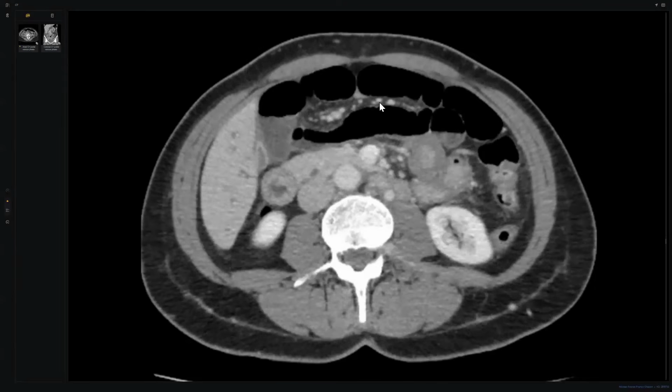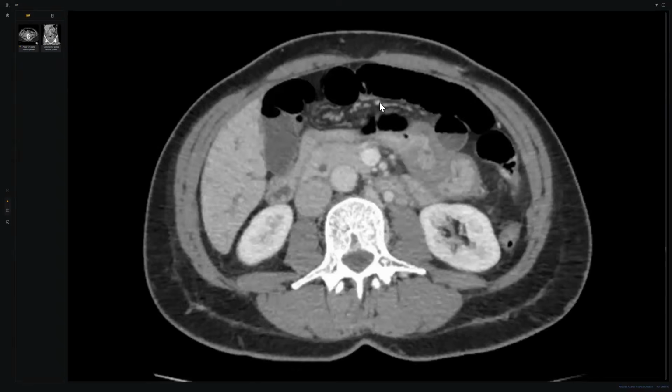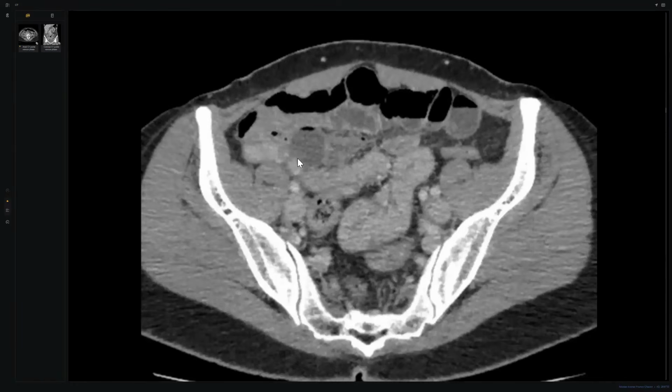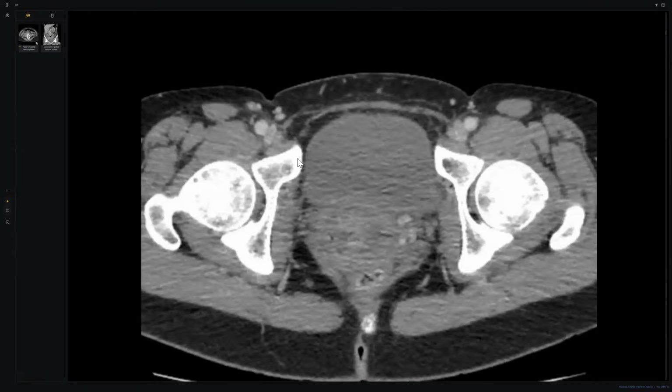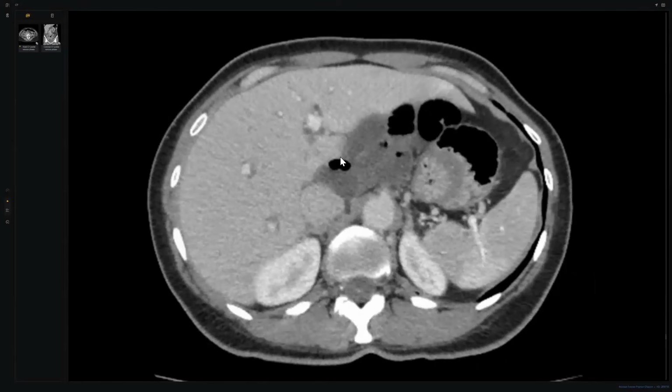Thank you, doctor, so much. What happened here? I give here misleading looks like misleading history. So our colleagues concentrate, and most of us will do like this, concentrate here. Okay, but the pathology is completely in the lesser sac.